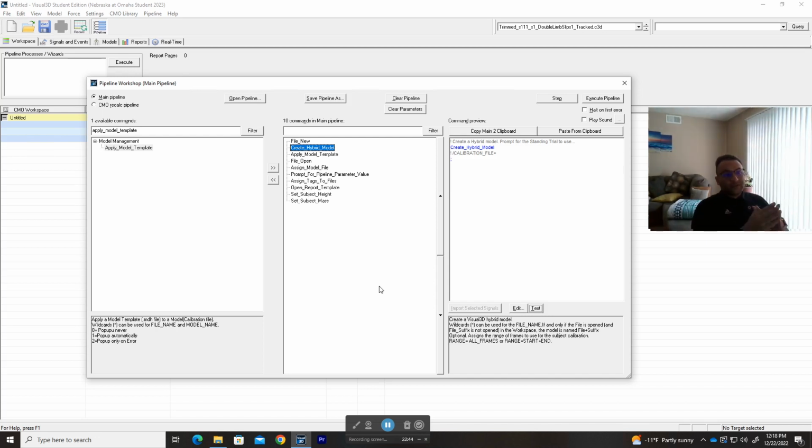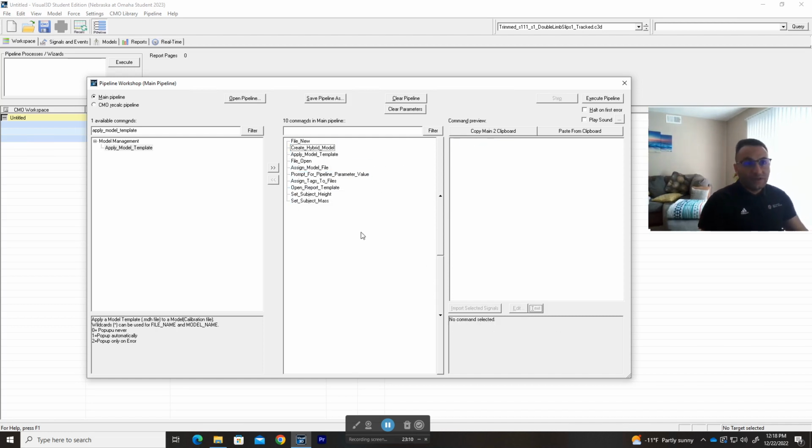But if you have a C3D file and you collected your data from a motion capture software that does not allow you to do that, you can do that here in Visual 3D. But it's also mainly used for other high-end biomechanical analysis to condition your data and process it. Like the basics are filtering and interpolations and all those things.